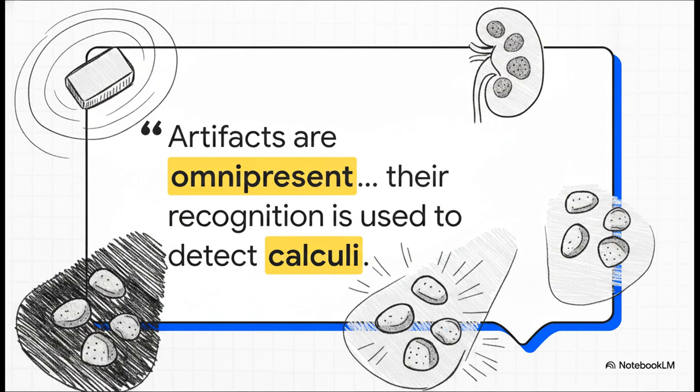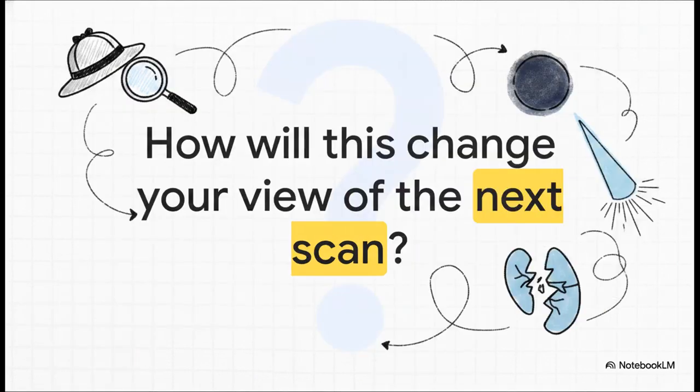Once you truly understand the physics behind the image, the rigid rules, and exactly how biology breaks them, these machine flaws are actually the very keys to solving complex veterinary and medical cases. The shadows, the spotlights, those mirrored ghosts, they are literally the tissue announcing itself to you. So, as we wrap up this explainer, I want to leave you with a lingering thought. How will decoding these machine hallucinations change the way you view your next patient's scan?